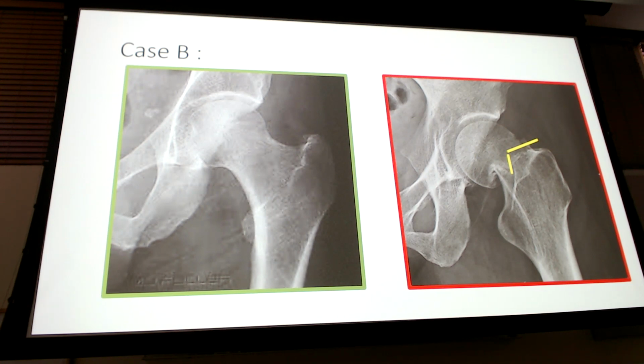So if this were avascular necrosis, let's go through that real quick. Avascular necrosis was femoral head and scaphoid is an area that disrupts that blood supply, so we end up with that dead bone, right? So remember that you can have a fracture of the scaphoid or a fracture of the femoral head, and if you catch it early, you don't have avascular necrosis yet. That's what happens when we miss it, okay?